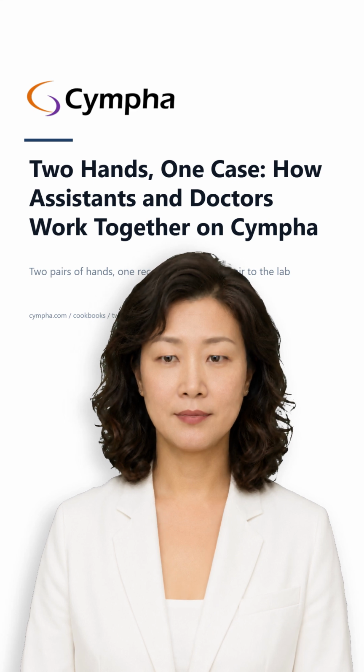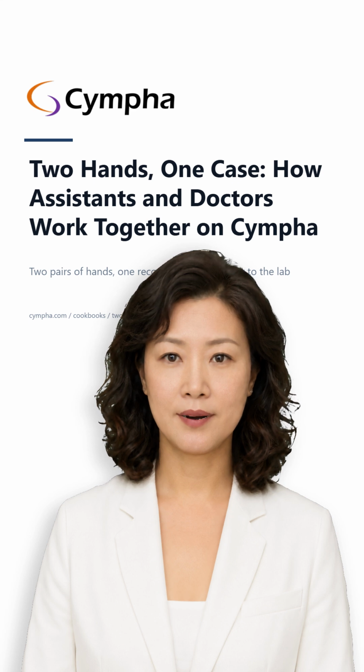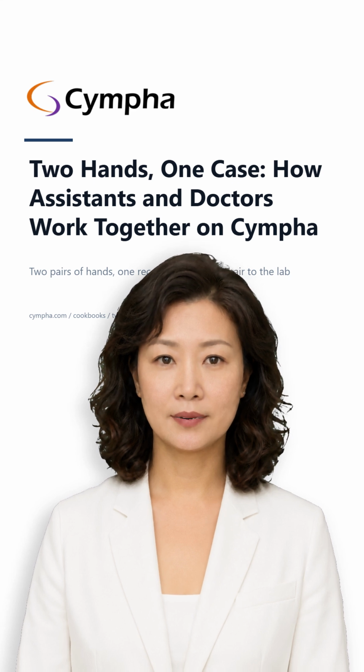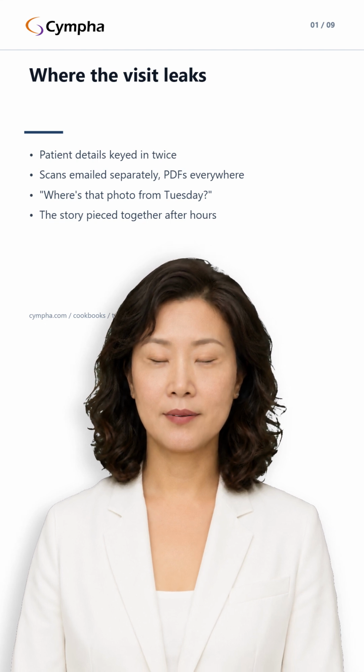Today we're going to talk about creating a case together on Cympha, from the chair to the lab. Most dental practices run on two pairs of hands. The assistant seats the patient, takes the photos, captures the scans. The doctor walks in, examines, and decides. The hard part has always been the seam between them, the place where one person retypes what the other already did. This is how Cympha closes that seam, all the way from the chair to the lab.